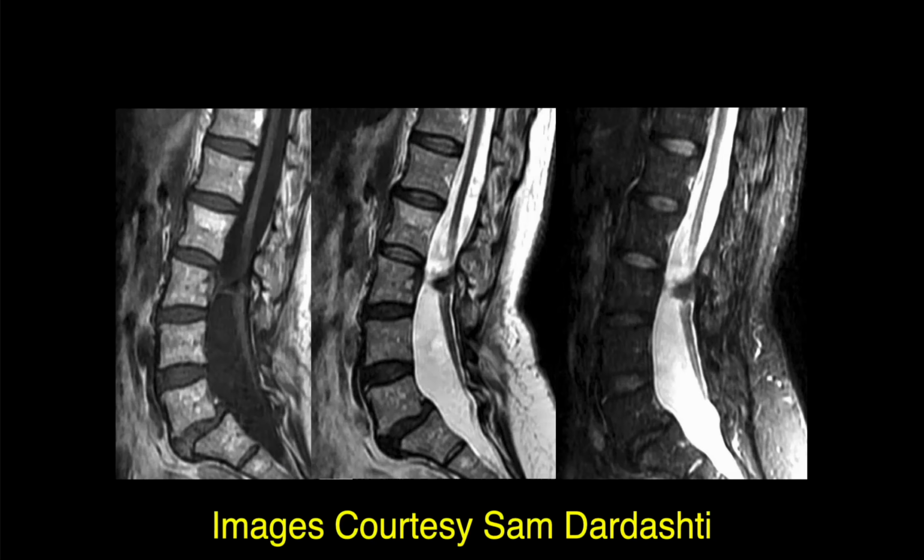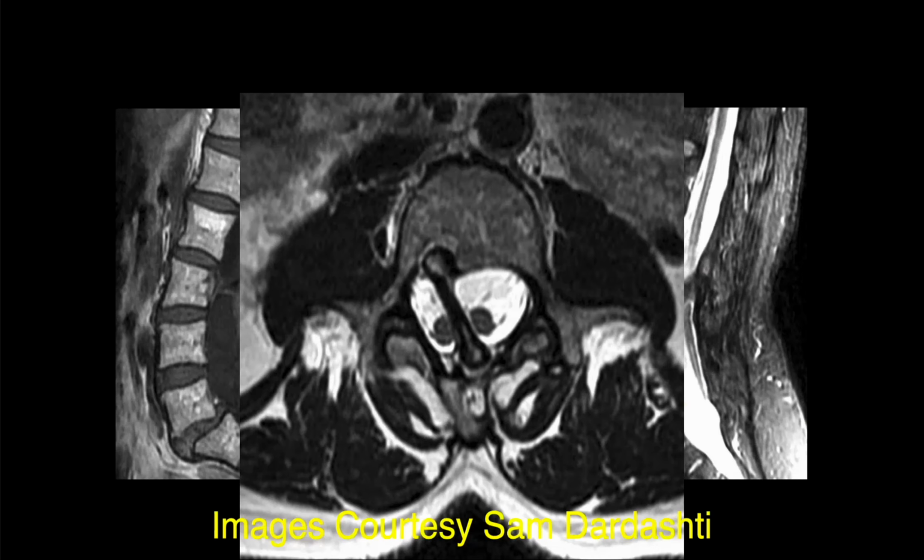Okay. Robert. All right. Here it looks like there's an abnormal signal at the level of L3. Looks like maybe a fibrous band or something, but I want to see some axial imaging through that. Okay. Yeah, so it looks like a cleft and it looks almost osseous to me.